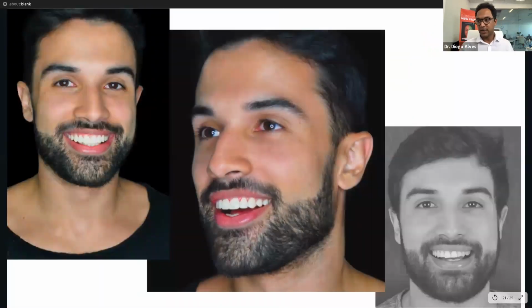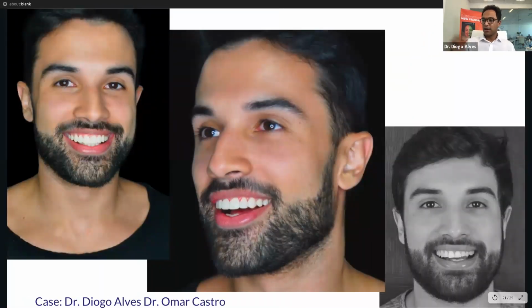Here's another case. That's how that patient, like I showed before, looked before, and that's his after. This case is new. It's been about 7 months. He just sent me a video yesterday. It looks amazing. So yeah, this is basically one of the ways that you can use the digital technology, the DSDApp technology.